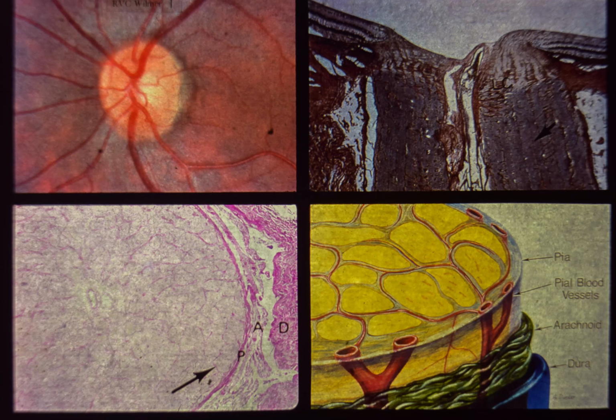In most normal eyes, the optic disc has a central depression or cup. The cup is generally circular, and while the area of the cup often does not exceed 30% of the total disc area, cups that occupy up to 80% of the total area may be observed in normal eyes. The boundaries of the optic disc are generally distinct, owing to the relative transparency of the peripapillary retinal nerve fiber layer, through which one can see the termination of retinal pigment epithelium at the border of the disc.